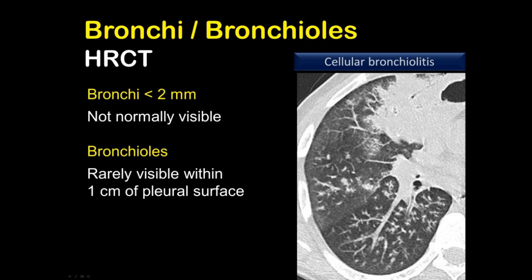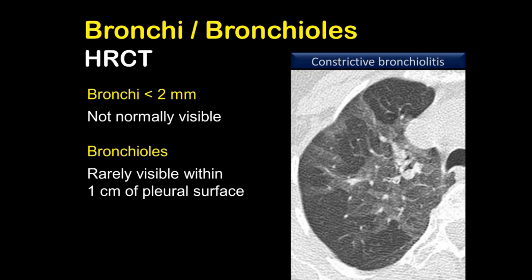in a patient with pulmonary TB, or in patients where we can see constrictive bronchiolitis or fibrotic disease. And in this CT we see areas of normal lung, that are these areas of hyperdensity, and areas of air trapping with diminished vascularity in a patient with constrictive bronchiolitis.